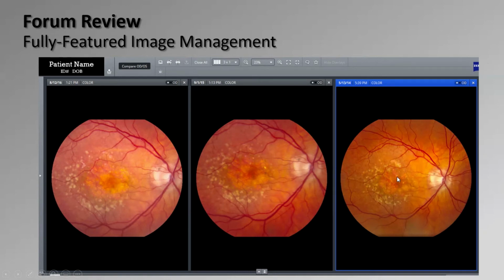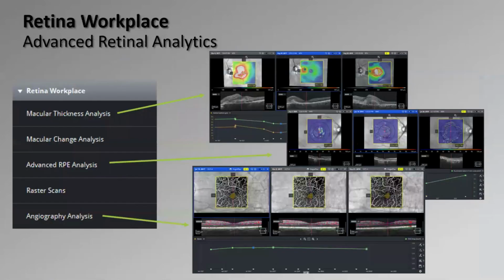patient record page, you have those little thumbnails. If you highlight, say, 3 thumbnails from different visits, you can right click and hit document display, and it brings in automatically this sort of comparative array. In this case, it's a 3x1, but you can change that up. It can also sort of automatically choose the best size. If you chose, say, 4, it'd be a 2x2, et cetera. But again, a nice way to review fundus images in a longitudinal fashion.